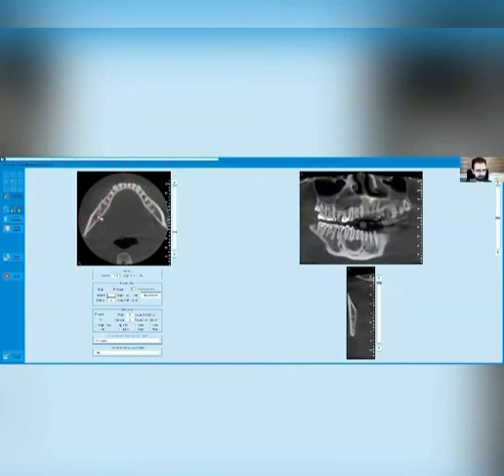You can scroll up and down if you cannot see the canal at some sections, so as to visualize it and don't miss any sections, or just don't mislabel the canal because it may cause misguidance for the surgeon or any other specialist or any dentist that needs help from the nerve tracing to do any treatment.